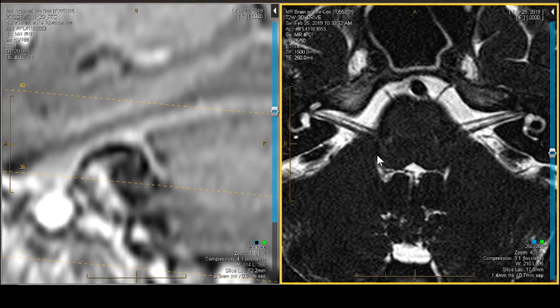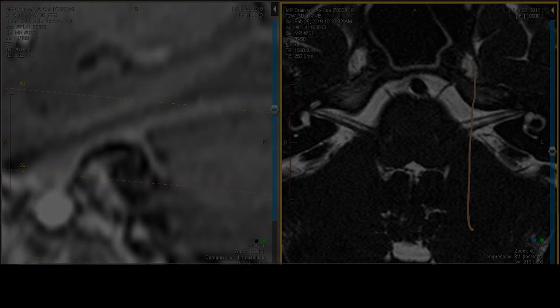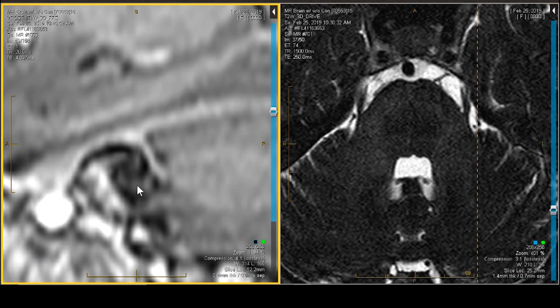So now let's utilize an MRI to look at the apparent origin of the seventh nerve, anterolaterally in the pontobulbar sulcus, and then look at the appearance of the seventh nerve and its relationship to some of the other structures around it as we decide on the individual segments of the seventh nerve. So I am going to look in the sagittal projection pretty much orthogonally like this. And when I do that in the sagittal projection, I end up with 4 dots. 1, 2, 3, and 4. Let's take a look at those 4 dots.